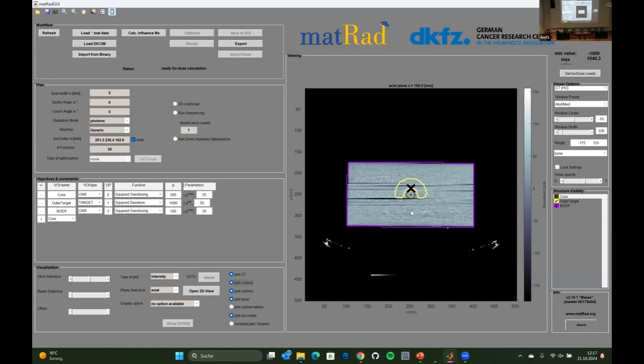But it's super integral that this isocenter is at the correct position in the patient during positioning. It's a really big part of setting up the patient. You see that this is automatically set. These coordinates are relative to the image. So we see somewhere here, it's at 251 millimeters in X, 326, at 236 in Y and some value in Z.